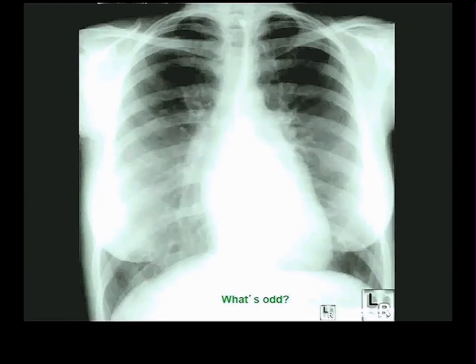Something is wrong with this person. It looks like there were 3 bulges, one here, and then this here. You're right. You're absolutely right. He said it looks like there's 3 bulges above the left ventricle. Here's the border of the left ventricle. We only expect 2 bulges and 1 concavity. The 2 bulges are aortic arch and pulmonary trunk, and the concavity is the auricular appendage of the left atrium.